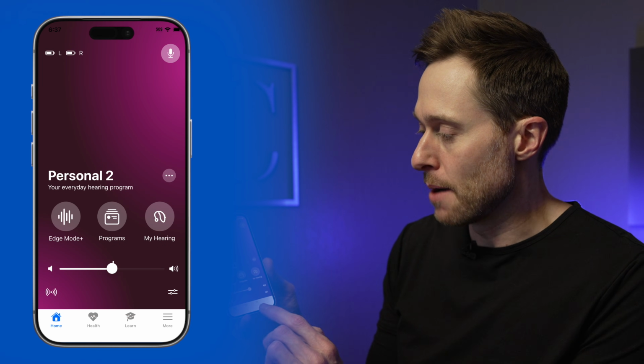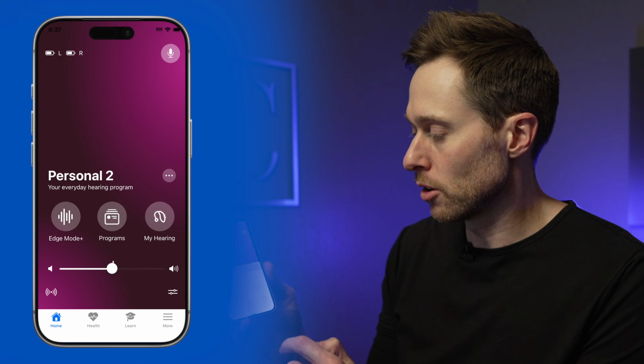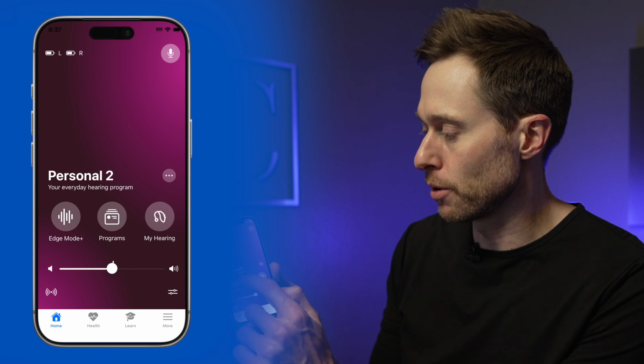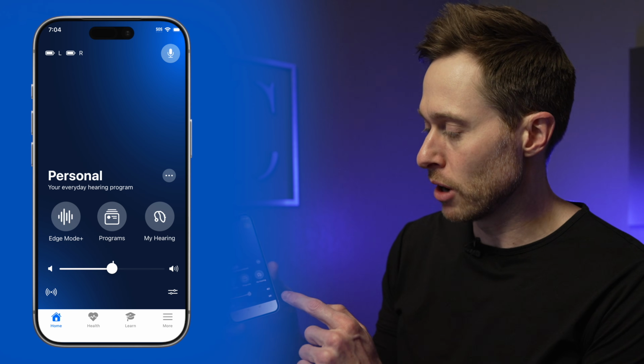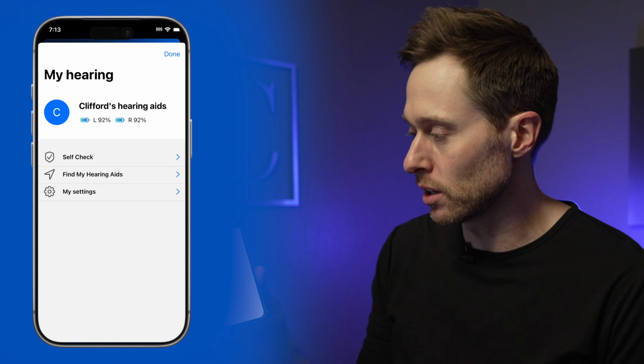So, all right, just to make things look clean here, I'm going to go back into the program screen, click on Personal. Okay, so there we go. We are back in the Personal program. And right next to Programs, you see this My Hearing button. So we're going to click on that.